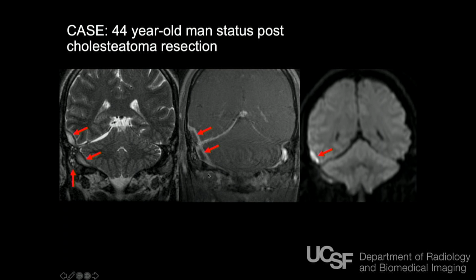This is actually extremely difficult, by the way. I have a tumor lecture where I discuss this, but it's very problematic in the post-operative setting to try to distinguish pus from hemorrhage. It's very, very difficult. So both of those entities will be bright on a diffusion-weighted image. So it's really frequent that we have a case that comes from neurosurgery where the patient's 1 to 2 weeks out from surgery, with suspicion for infection.